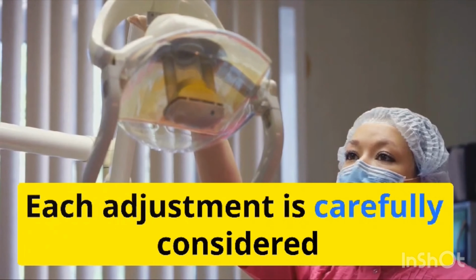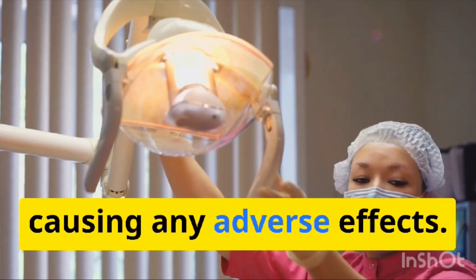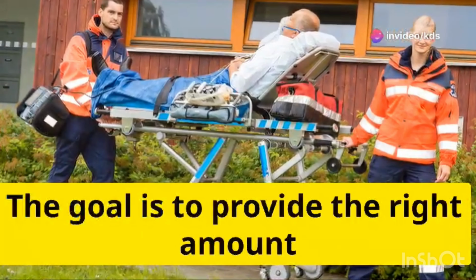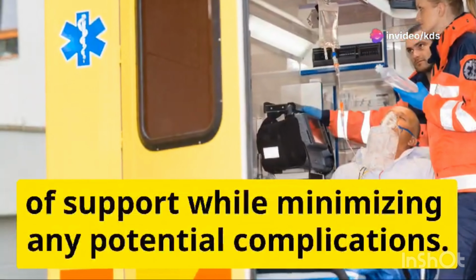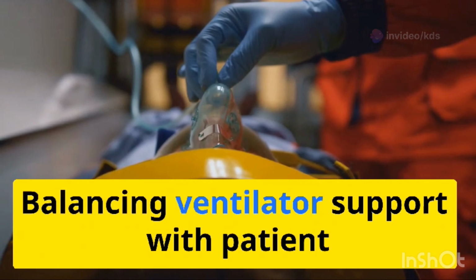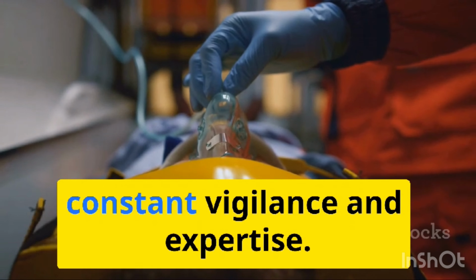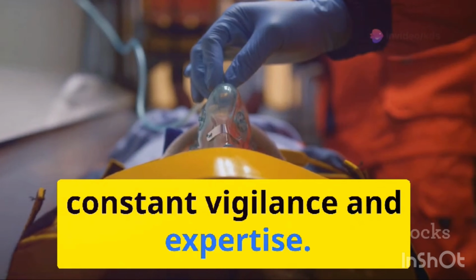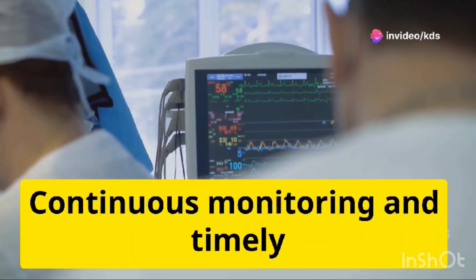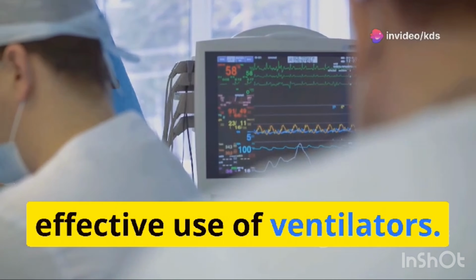Each adjustment is carefully considered to ensure it benefits the patient without causing any adverse effects. The goal is to provide the right amount of support while minimizing any potential complications. Balancing ventilator support with patient safety is a delicate task that requires constant vigilance and expertise. Continuous monitoring and timely adjustments are essential for the safe and effective use of ventilators.